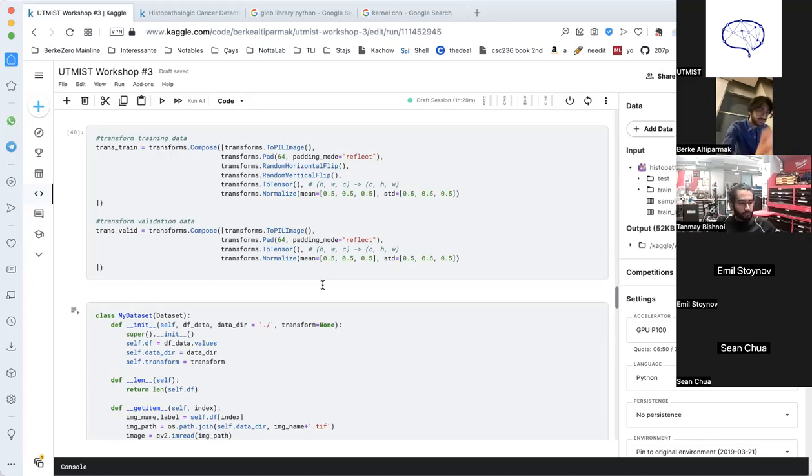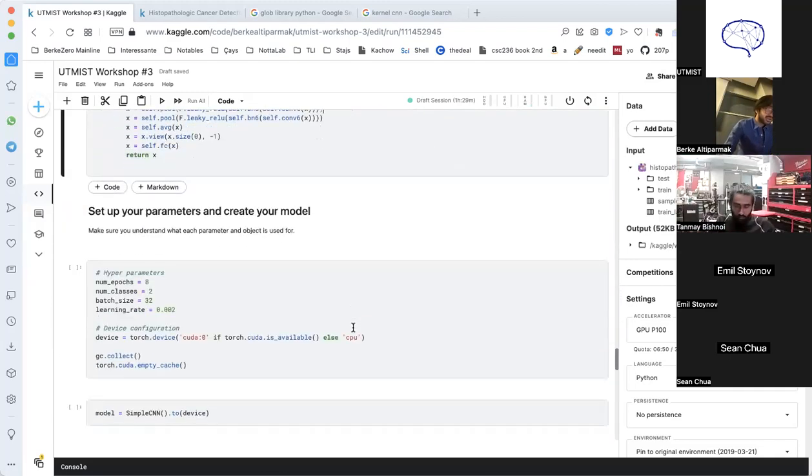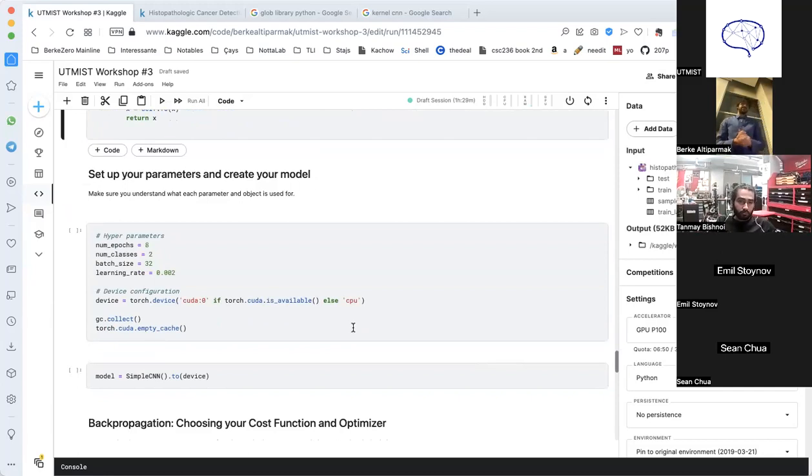All right. And we are moving on. This was our class. So we will set up some parameters. It's already given to you. Let me explain what these parameters mean.